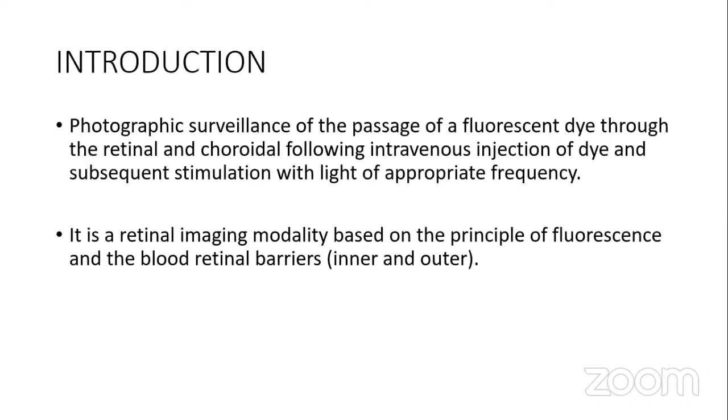So the basic is still that FFA, for short form, is photographic surveillance of the passage of a fluorescent dye through the retinal and choroidal circulations following an intravenous injection. And from what we said, this is possible because the dye is intravascular in the normal eye.